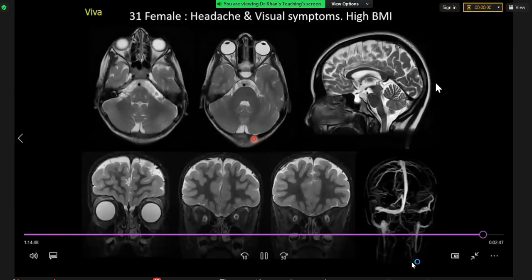So knowing that the patient has idiopathic intracranial hypertension, there's a generalized increase in the subarachnoid space, more than you would expect for a 31-year-old patient, especially obvious at the vertex aspect of the brain. Looking on the axial T2, we can see that both optic nerves are tortuous and kinked, with some high signal around their sheaths of, again, CSF signal intensity.